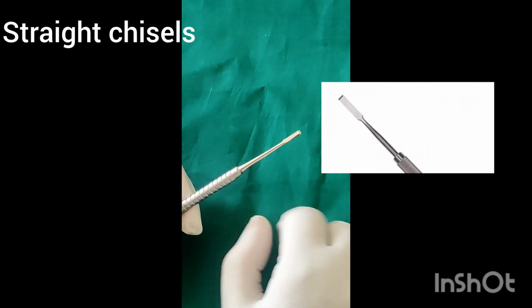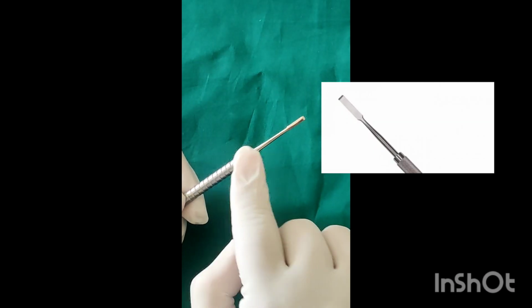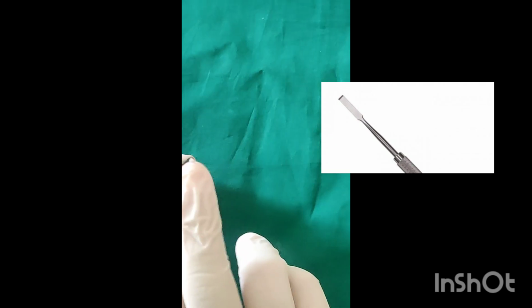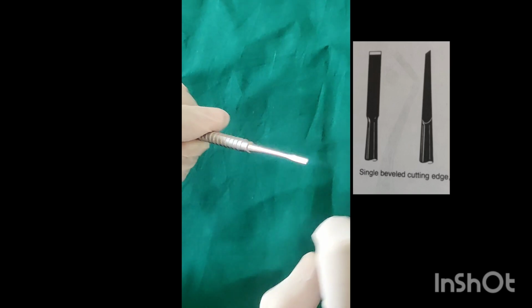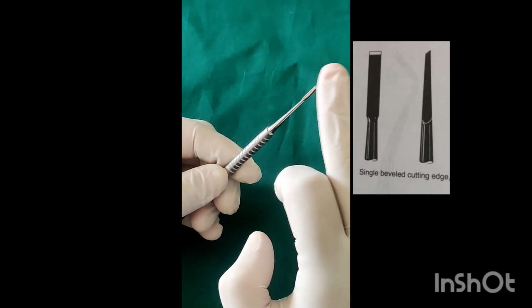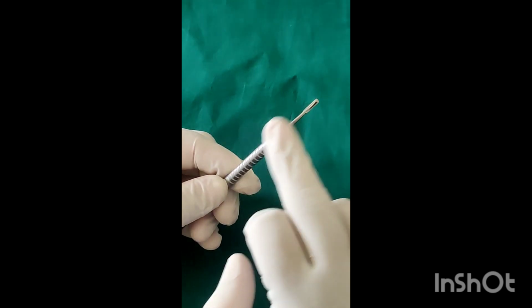This is a straight chisel. It has three parts: handle, shank and the blade. It is a single-sided bevel instrument. Here you can see the bevel. It is single-sided. The primary cutting edge of the chisel is perpendicular to the long axis of the handle.